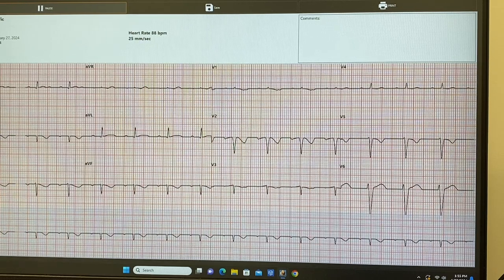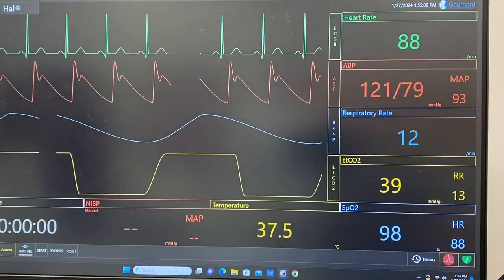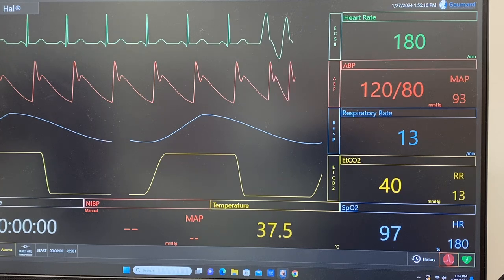Okay, that's not showing us anything good. So go ahead and X that out. Sorry, you're going to have to go through the tally. So, yeah.